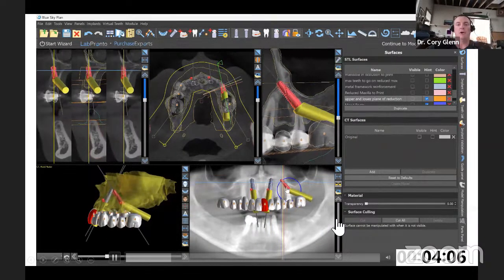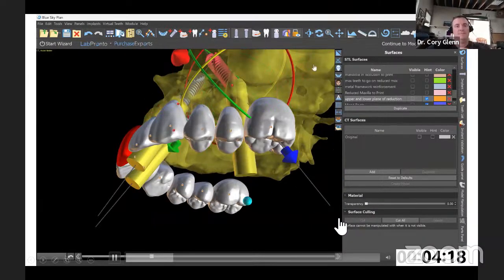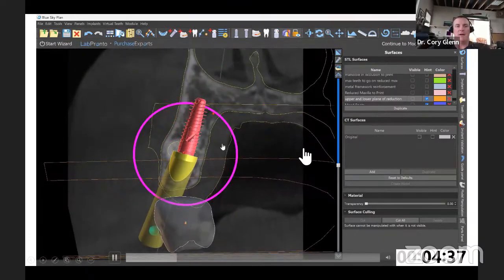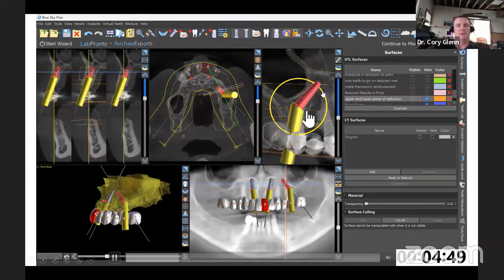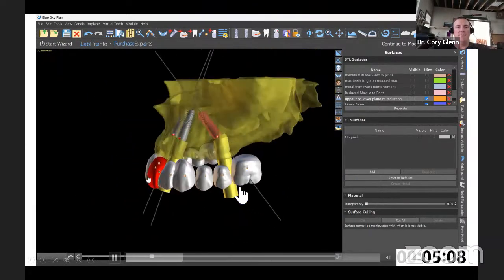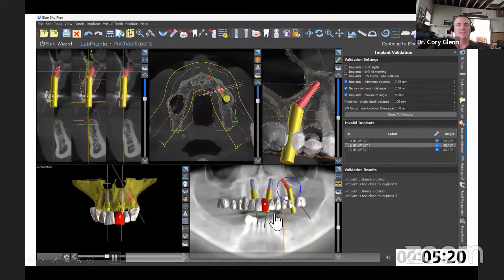I've placed a 30-degree custom abutment on them. Once you do that, it may not be going 30 degrees in the right direction, but you can spin that around and play with the timing. Again, I'm going just apical to that 16 millimeter plane, and I want to make sure it's in the volume of bone. And then by just twisting the timing of it, I can determine where my emergence needs to be.